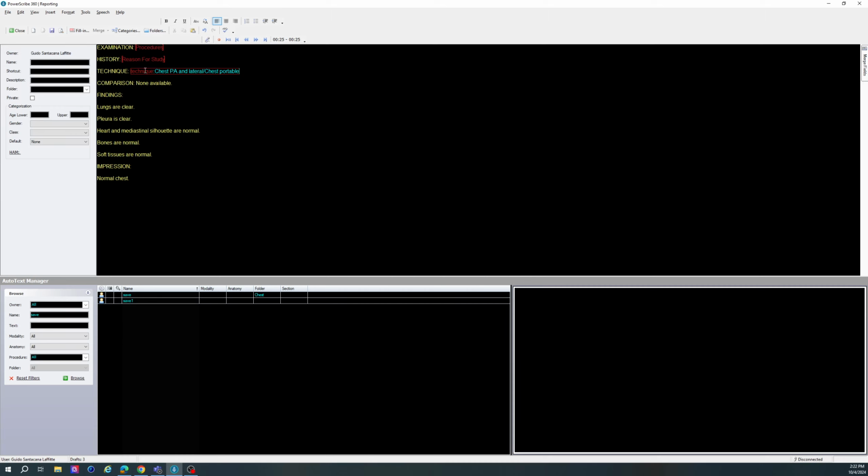And what that does is it creates a list of items that you can just double click and it will automatically populate once you open up your study. For comparison, I don't have much of an option. Usually we don't, unless your system gives you the merge field for it. So what I do is I just create a filling field.